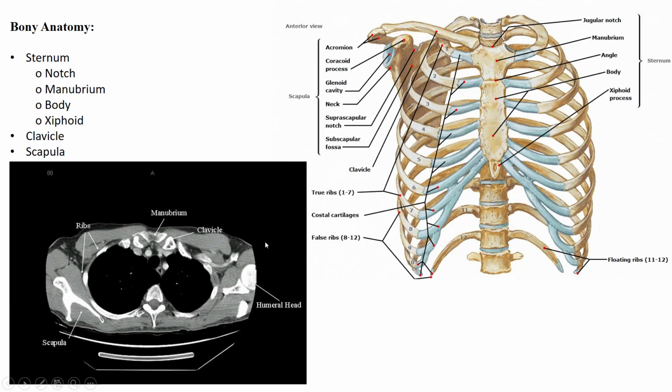Looking at this on a CT image, we have the posterior side of the patient here, anterior, right and left. You can see the scapula on the posterior side of the patient here, and the spine, and how the ribs articulate in the back with the spine. And as they come around, you're seeing pieces of different ribs here as they come around and articulate with the sternum or attach to the sternum here through some cartilage. Those are called costal cartilages here in the front. As you can see in this blue, that's costal cartilage.